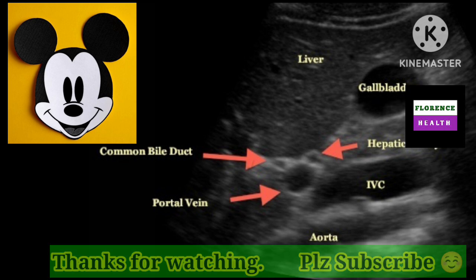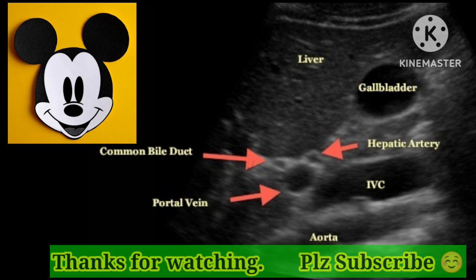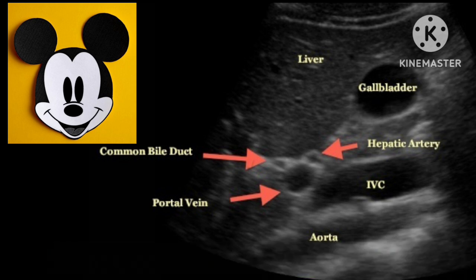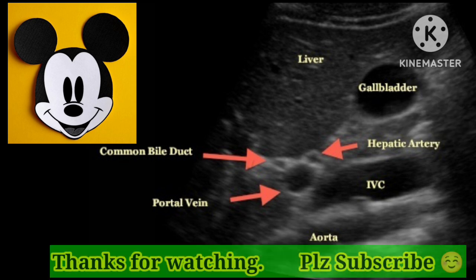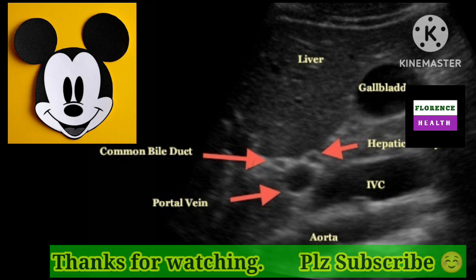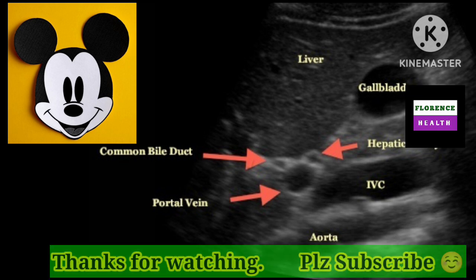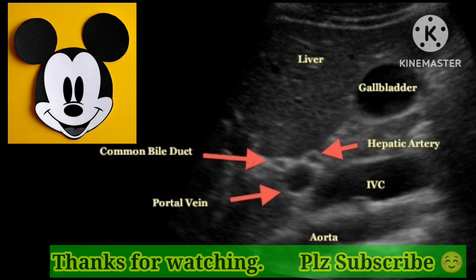This slide shows the Mickey Mouse view of the portal triad, where the face itself is the portal vein, the right ear is the CBD, that is the common bile duct, and the left ear is the hepatic artery. These three structures form the Mickey Mouse view of the portal triad. See the neighboring structures of the gallbladder and where they are situated: inferior vena cava, aorta, gallbladder, liver. These are the important landmarks you should remember while recognizing a gallbladder on ultrasound.